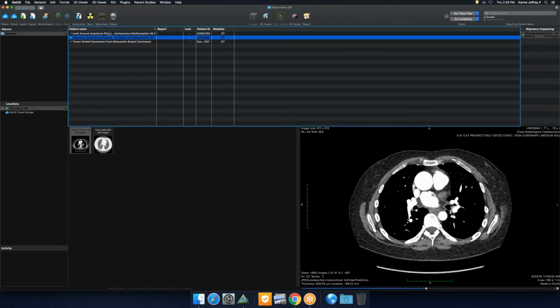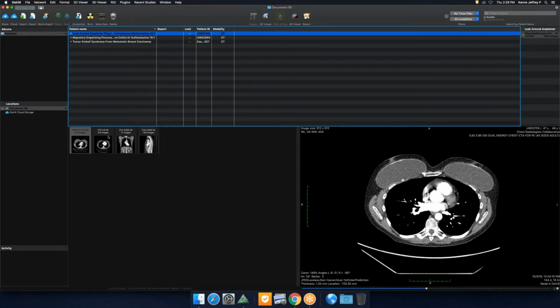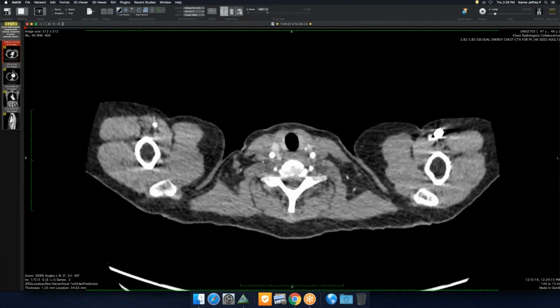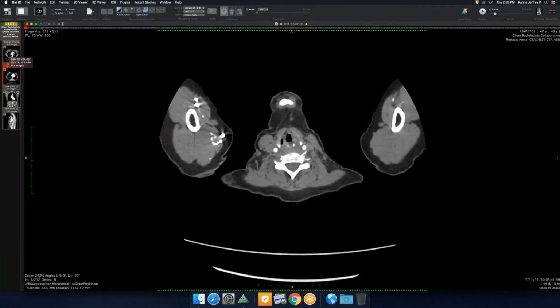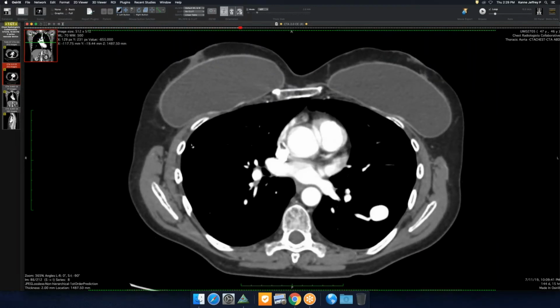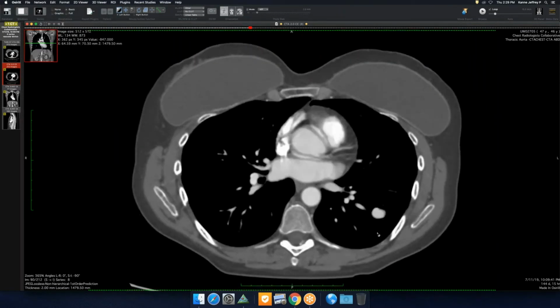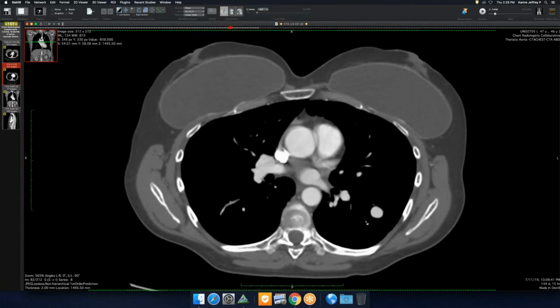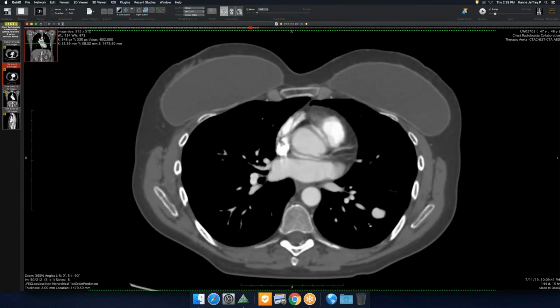Oh, sure. This is kind of something interesting. So this is a 46-year-old. I've got to get the right case. Yeah, that's the one, who had a pulmonary AVM, does not have HHT, but has this really large pulmonary AVM. Looks like it has a single feeding artery and single draining vein.